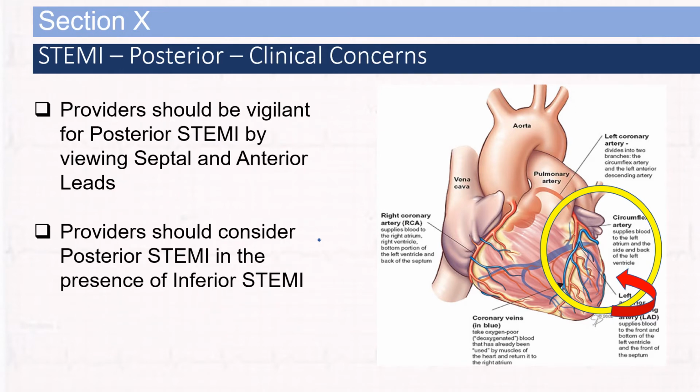Clinical concerns really have to do with the provider being vigilant for posterior STEMI by viewing the septal and anterior leads and giving consideration whenever there is an inferior or inferior lateral STEMI evolving in front of them.